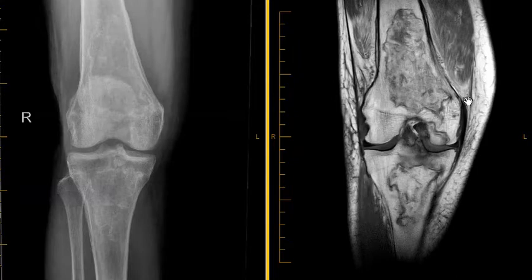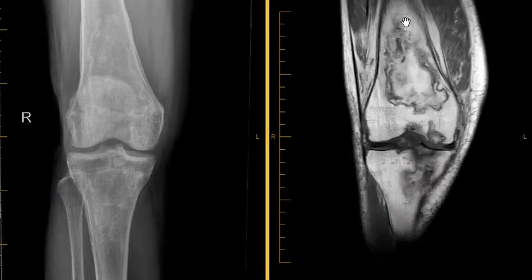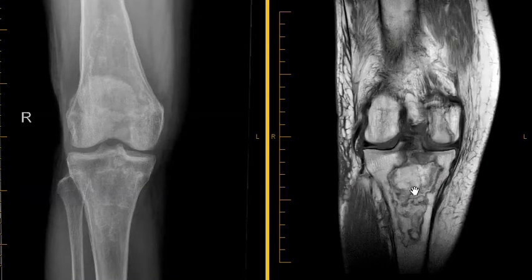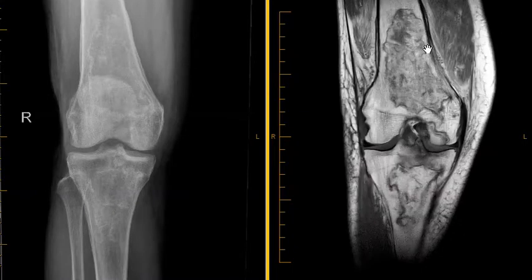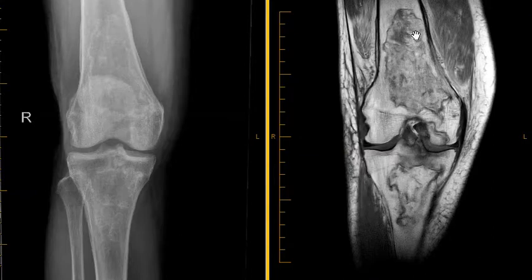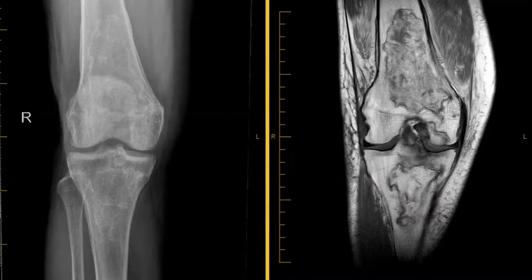This is where the blood supply gets compromised and the bone will die in the central medullary cavity and cause these big geographic regions of abnormal signal. She also had this really dark area here. This was some more active marrow edema, but this is just a case of osteonecrosis or avascular necrosis. There are a number of things this can be associated with. It looks really striking and terrible. You think there may be a terrible tumor or bone infection, but again, this is just an area where the bone has died because the blood supply is lacking, for any number of reasons.